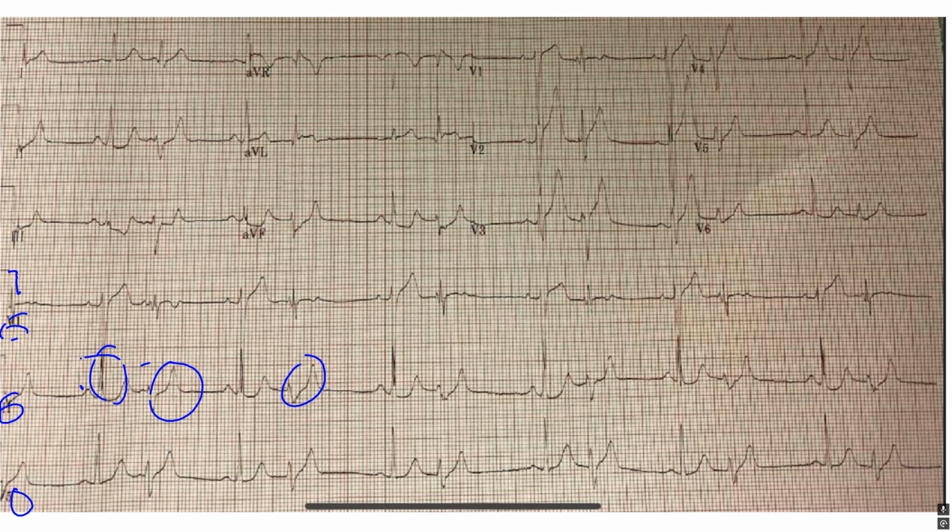Remember, when you have bigeminy, the question becomes, what's the heart rate and what's the pulse? The heart rate is something the machine tells you. The pulse is only something you can feel. As a heart rate, will it be 13 times 6? It'll be normal, or it'll be 13 times 3. It'll be bradycardic at around 45. So you have to go feel the pulse for that.